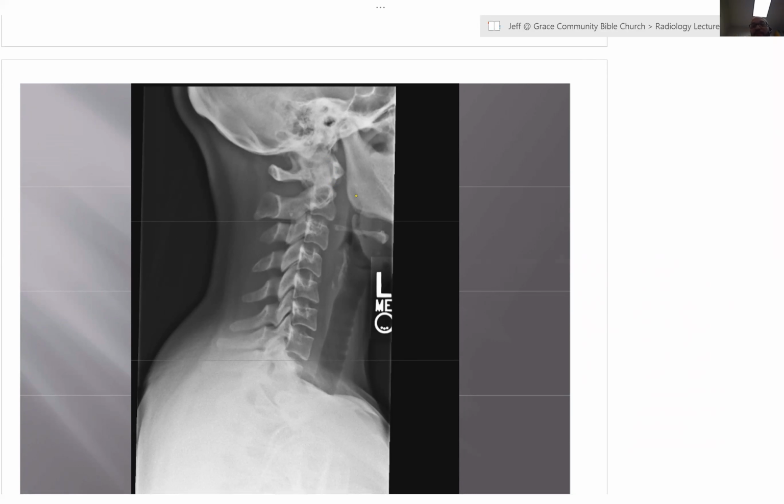Now, but don't get satisfaction of search here. Technical, alignment, bone, cartilage, soft tissue. Look all the way through to the soft tissues. And what do you see? Anterior swelling again. Yeah, and because we just saw it, we say to ourselves, he's not going to show me 2 of these in a row. And because we already made a finding of rotation, we tend to say, I've earned my paycheck. That's my finding. When we need to keep looking, and I am with you. Look at that. In front of C2, it's swollen again.